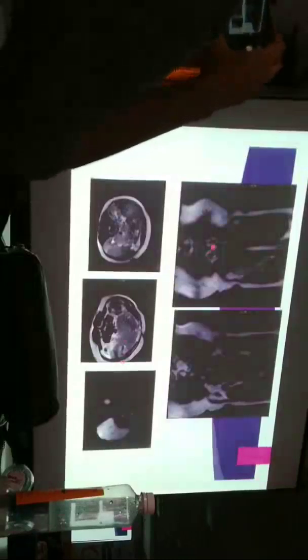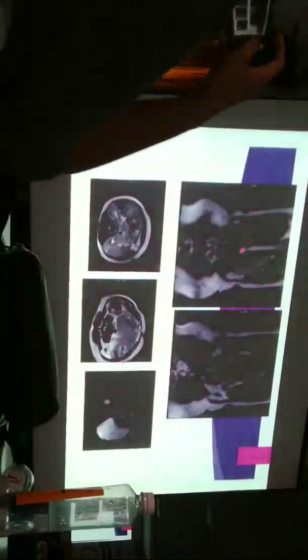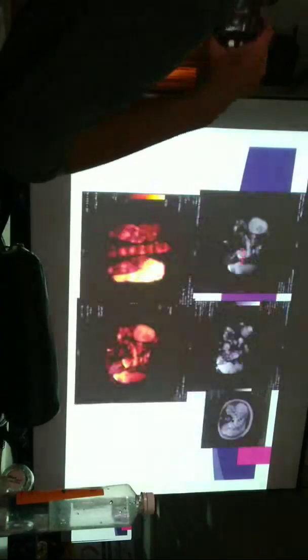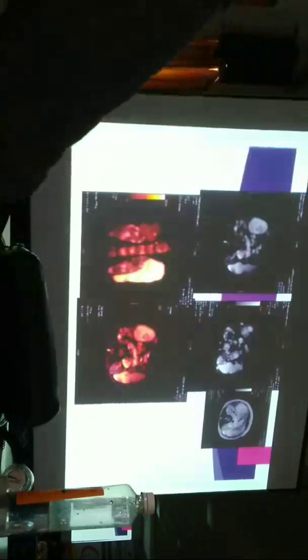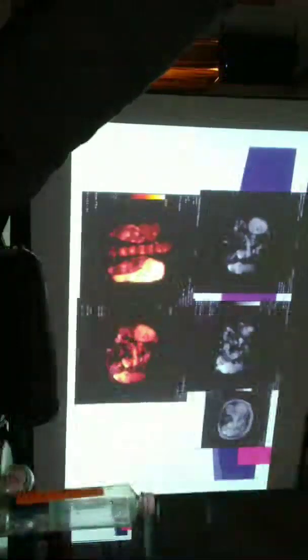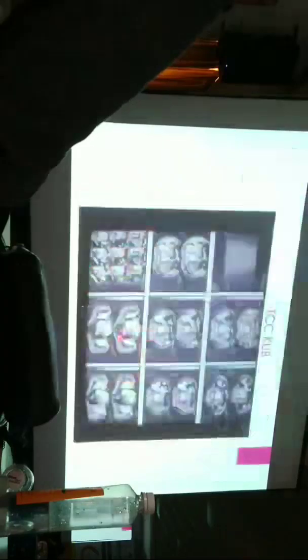The corresponding MR image also shows the lesions, which are seen in both renal parenchyma. And this is called an MR fusion image, where we fuse the T2-weighted image and the diffusion-weighted image. So in case of any follow-up or any oncology, fusion imaging is very useful to make the lesions more conspicuous. Wherever the software is available, we can just fuse the T2-weighted image and the diffusion-weighted image to assess the extent and also to delineate the lesions more clearly.